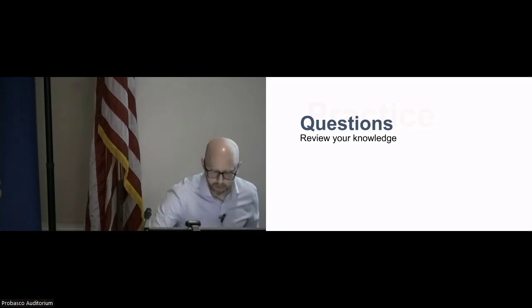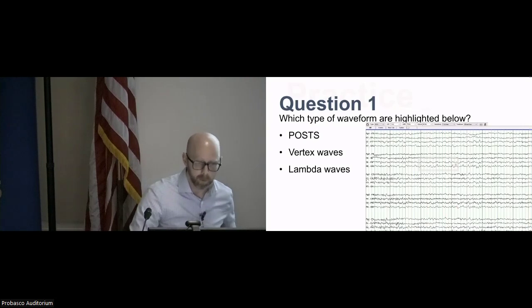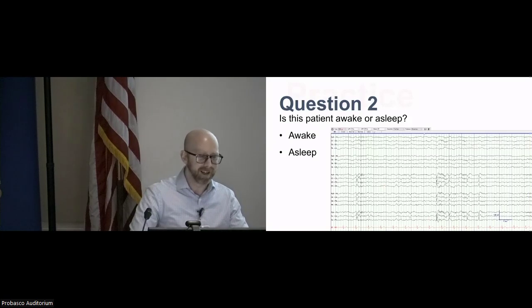And then we are in the final home stretch for those who have clinic. What type of waveforms are these highlighted here? Well, the person's not wide awake, right? You don't see any eye blink or horizontal eye movements really. So they're probably drowsy or asleep. Plus, that's the title of this section of the lecture. So they're probably positive occipital sharp transients, which is incorrectly labeled again because of formatting, and keeps me on my toes. I have to just know the answer. I can't rely on that.